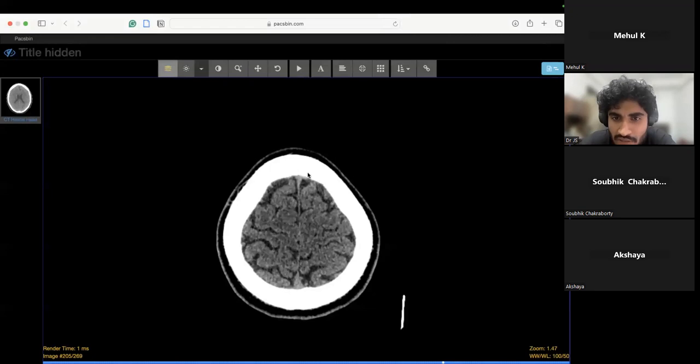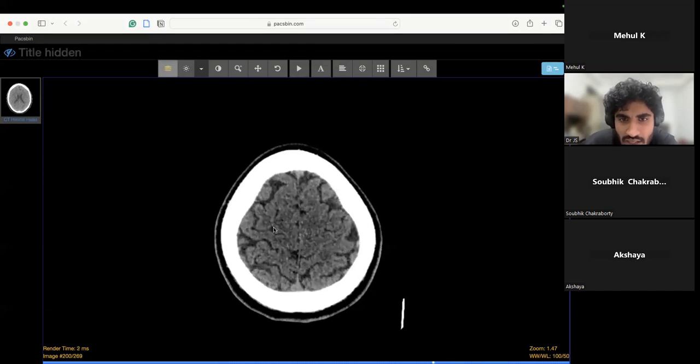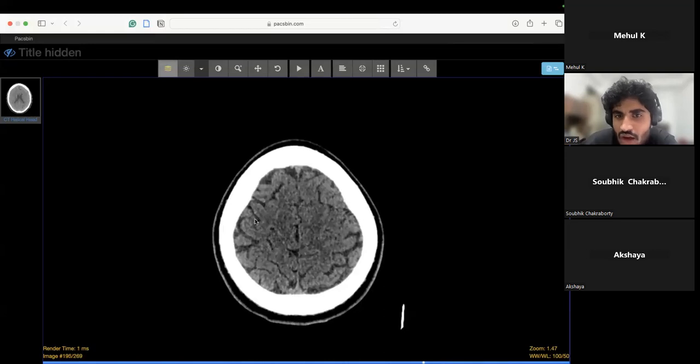Here is the high frontal, and here is the high parietal. I'll scroll down again. Now you can see there are some sulci here like a mustache. Just anterior to that you can see an omega-shaped structure. This is the central sulcus, and the precentral gyrus will be what, sensory or motor?